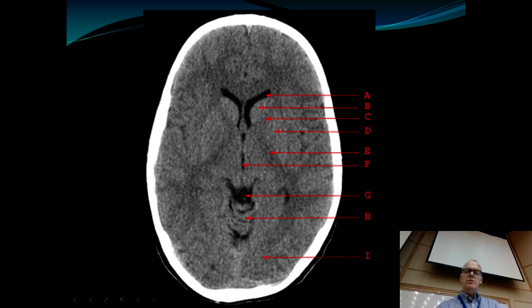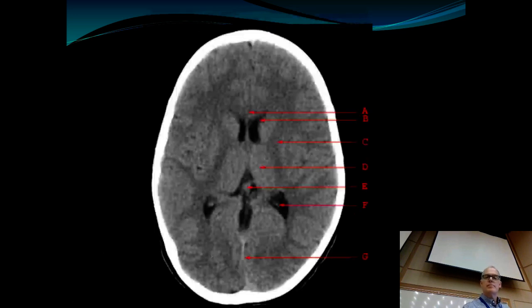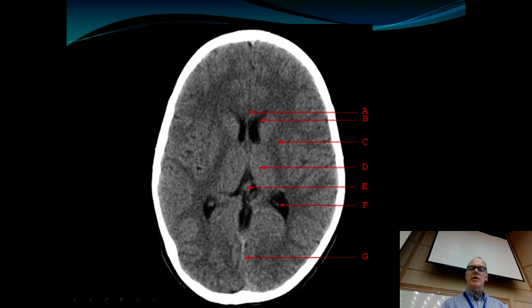All right, third ventricle, again that quadrigeminal space, so we're still looking here at probably the superior colliculi, upper portion of the midbrain. There's the vermis of the cerebellum and the occipital lobe, the optic radiations back here. Okay, more of the same here. Again, nice look at the internal capsule, caudate, putamen. This is the pineal gland right here. So in this case, it didn't calcify in this individual, but we're right above the midbrain. And nice look at the lateral ventricles here.